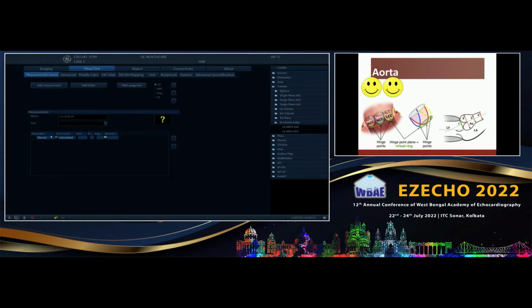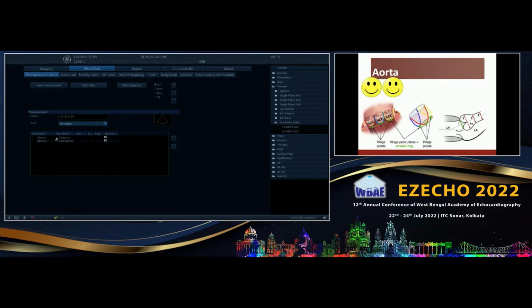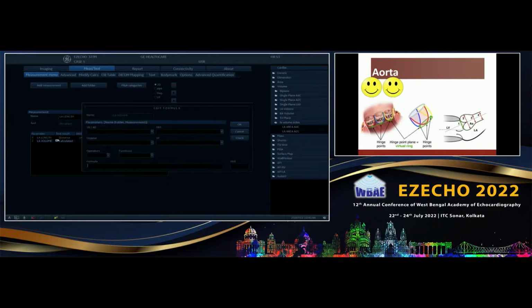It can elongate at a slightly different angle, and quite frequently in a dilated cardiomyopathy like situation, slight foreshortening of the apex, slight tilting of the probe may give the largest LA volume. Yeah. So try to take visually the largest LA volume. That is very important. The angle of enlargement can vary.